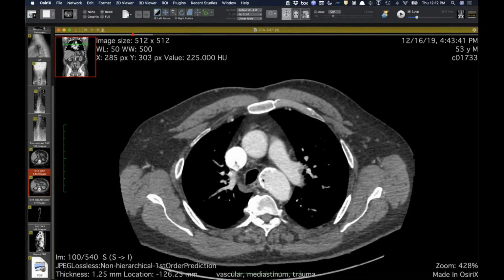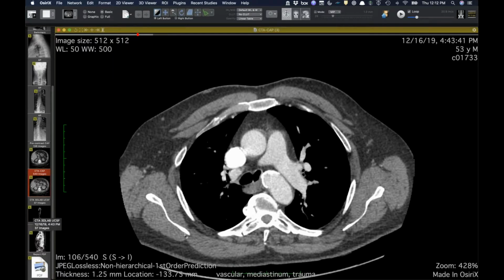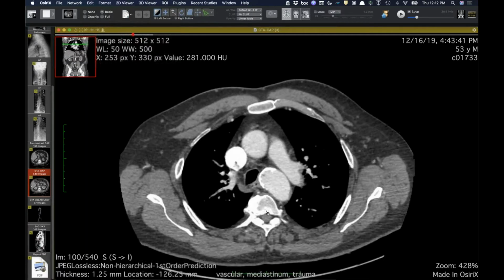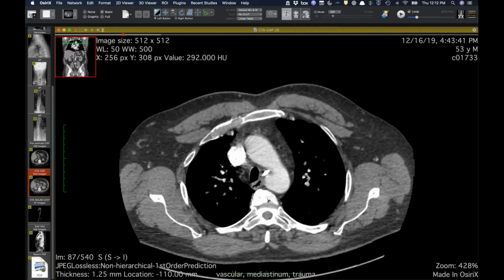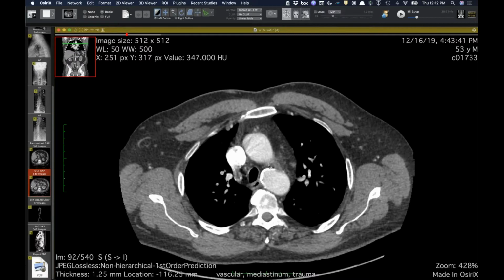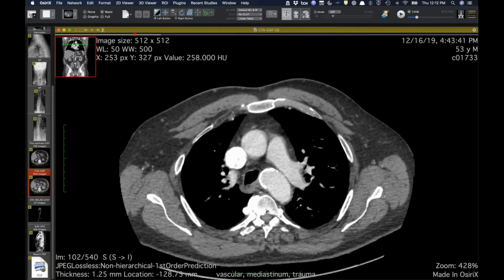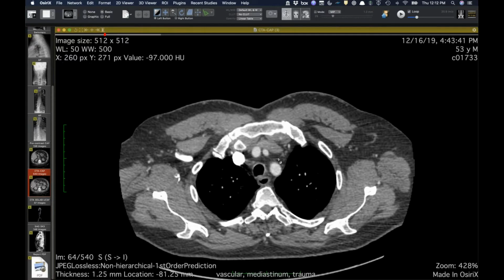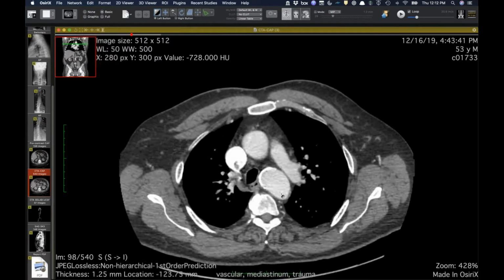So this is one of the guys that, in the pre-CT era, ended up with a traumatic aortic injury at the isthmus that healed and now has a pseudoaneurysm. And so this was incidentally discovered on one of the spine CTs they were doing. And so that's what prompted this CTA. But I thought the spine radiograph was kind of fun just as a good eye test for this, but they're not going to do anything because he's asymptomatic at this time. And if they did any sort of endovascular repair, they might have to do a carotid to subclavian bypass graft. So they're just going to watch.